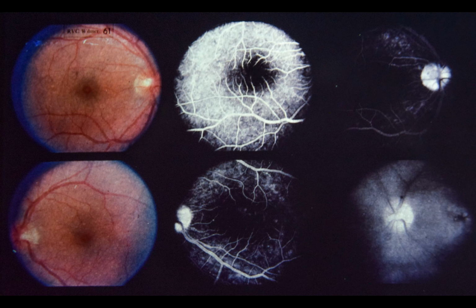Slide 61. Idiopathic retinal vasculitis of the posterior segment with cystoid macular edema. This 14-year-old white male represents the mildest form of retinal vasculitis that is part of the spectrum of pars planitis syndromes. He has had recurrent episodes of decreased vision in the right eye for 9 months. On each occasion, visual acuity in the right eye was reduced to the 20/80 to 20/200 range because of minimal macular edema.